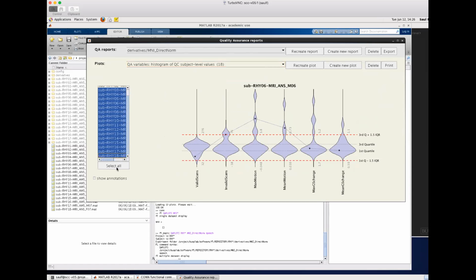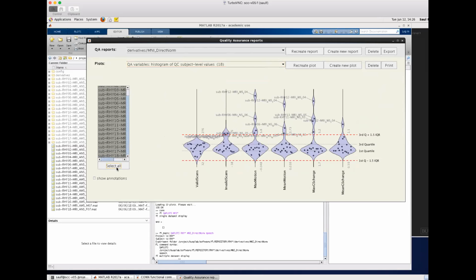Should you manually add these labels back? We recommend recording them. This just generates this plot based on the artifact detection portion of the processing.